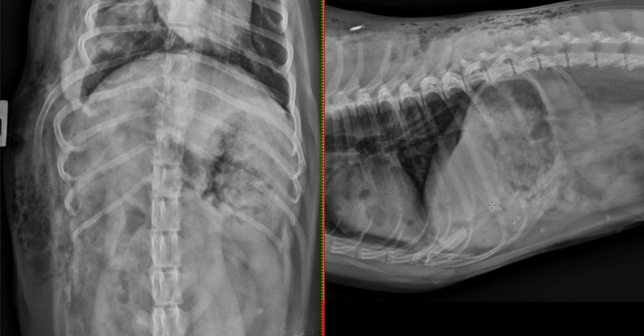In this study, we see the complexities of a big dog, little dog attack. The subcutaneous emphysema indicates the extensive shear force that occurs from the bite wound, which allows for pocketing of gas. The malpositioning of the right ninth rib, paired with the soft tissue thickening and gas in the pleural space, heightens the concern for compromise of the right thoracic wall. These findings can indicate penetrating injury.